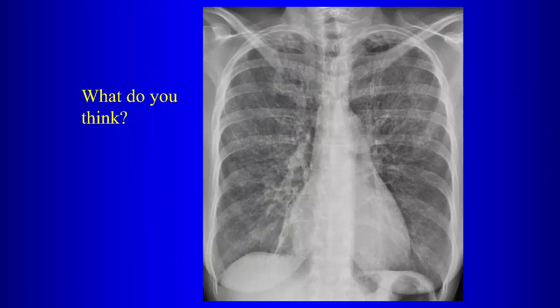Normal or abnormal chest radiograph? What is abnormal? Well, first of all, what do we think of the lung volumes here? Yeah, the lung volumes are increased. What else is abnormal? Probably interstitial. Yeah, where? Diffusely. Diffusely, is the upper look worse than lower? Right lower lung as well. So here I would say it looks like maybe a little bit worse in the upper lungs, okay?